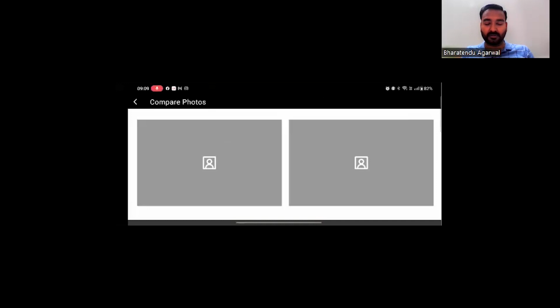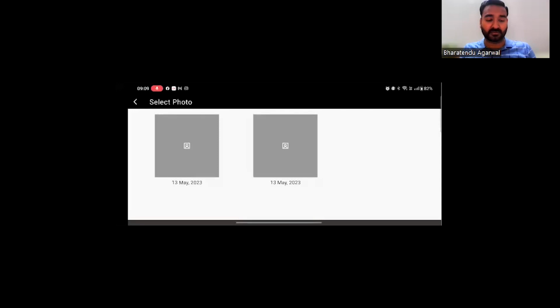Is it going to load? I think it takes a while to load. So let's just stick with it for a second because I did see it loading. Maybe it takes a bit of time to process, but it shouldn't take so long, because this is too long.